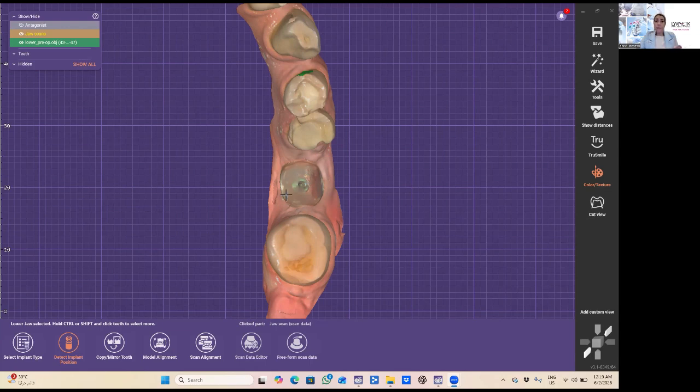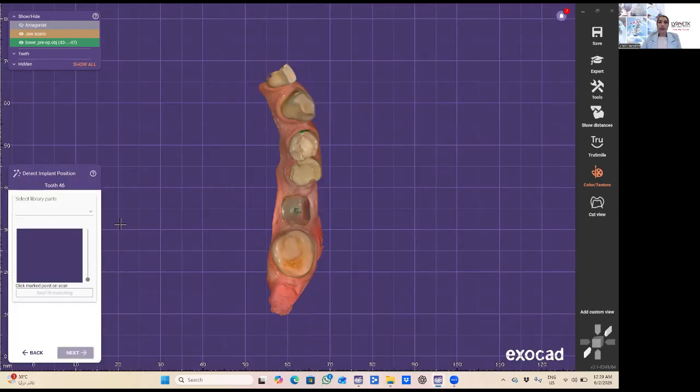This can be determined by the color of the screw. As we mentioned before, the iPhysio system uses color-coded captive screws, and each screw corresponds to a specific gingival height. In this case, the captive screw is green, which indicates gingival height 3. So now we have the 3 pieces of information. The iPhysio being used is type C, it is the short version, and the gingival height is 3. So let's start the design.